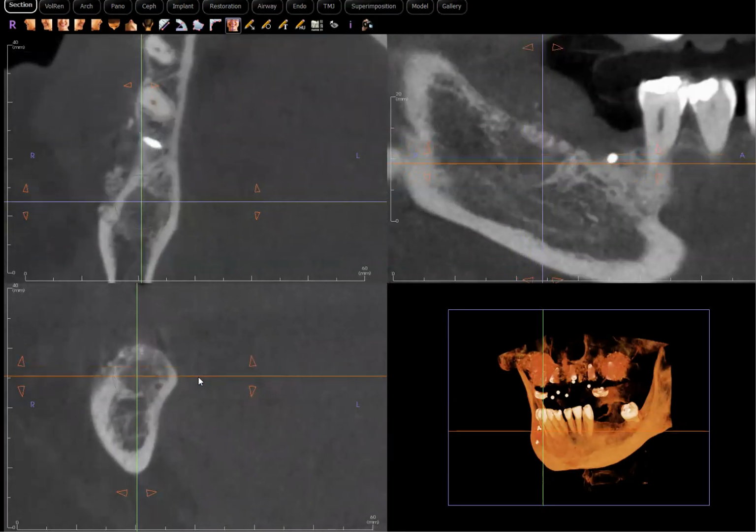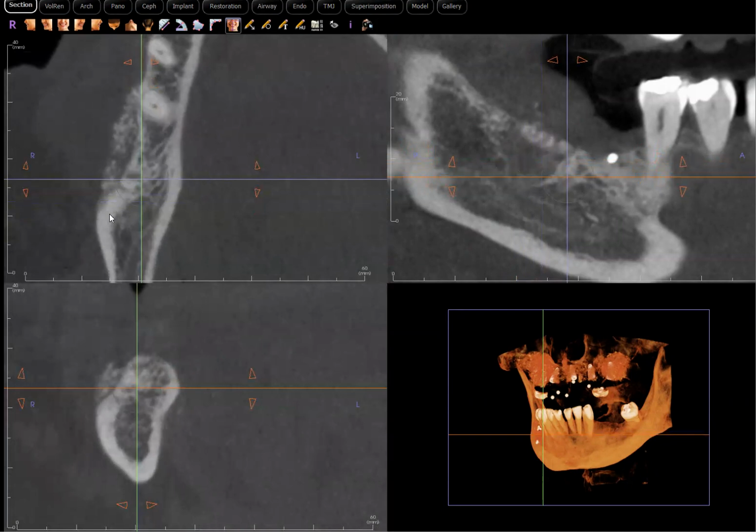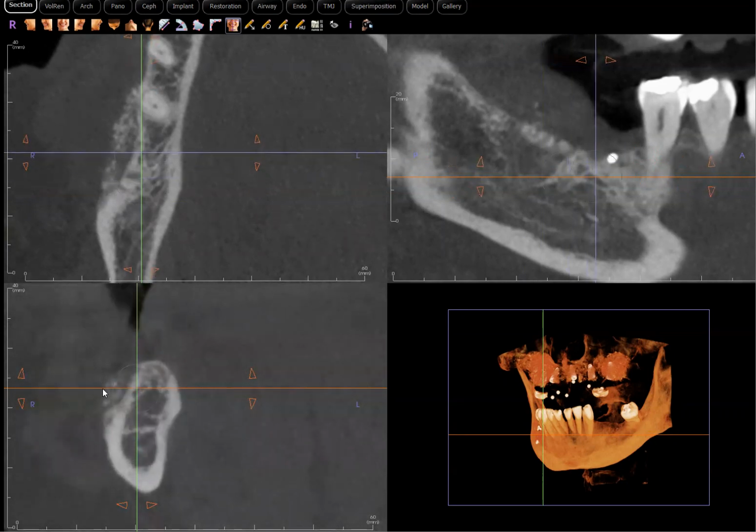And now what about the buccal graft material? We still see some areas of perhaps incomplete osseointegration, but again, looking much better. The radiolucent line is not throughout the entire grafted site, but rather I see more areas where they're literally in contact with one another. And here as well, that's an improvement. Even as you look at the coronal view, yes, we see that radiolucent line again, but even the width of this line, or the thickness of the line, has decreased compared to the previous scan.